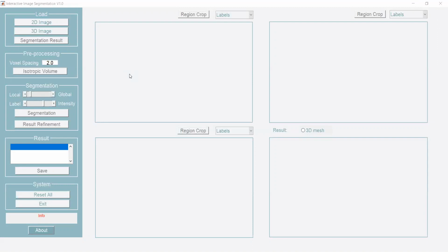Because we do a lot of medical image analysis, quite often the task is to do the segmentation. We can use the segmentation to train a machine learning or deep learning network to achieve automatic segmentation later, but it has to be based on very accurate segmentation in the first place. So we tried a few other tools. They either use active contour, or you need to draw a few dots along the lines, and also some techniques based on graph cut, which is similar to our method. But we find it's not very useful or user-friendly, and some of them are pretty slow.